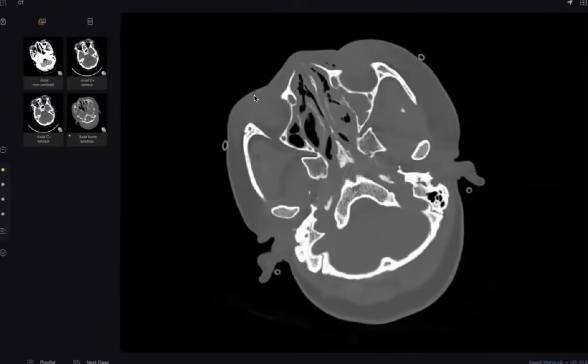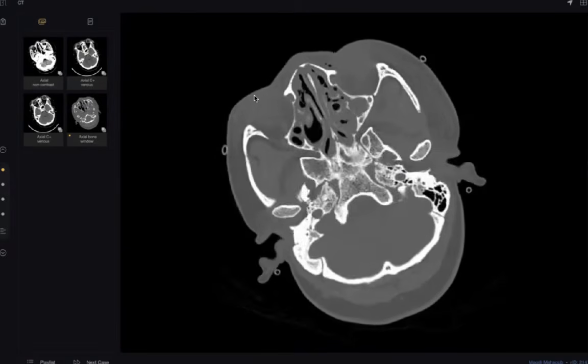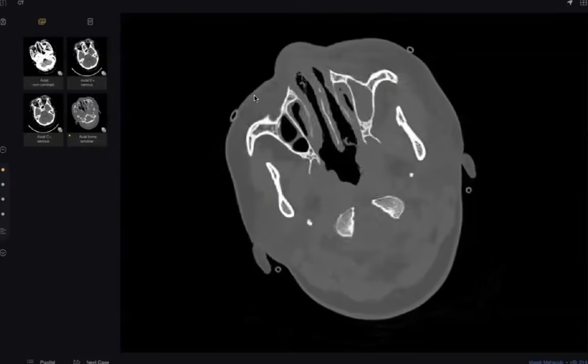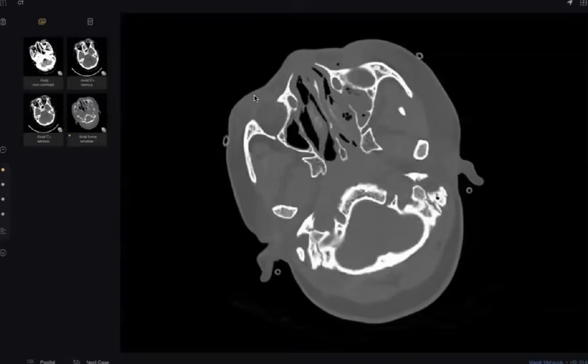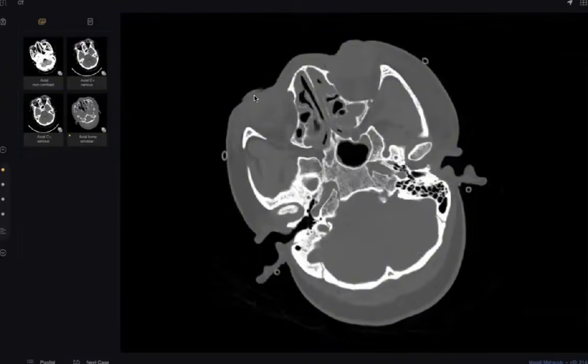Do you have any clue here in this CT, whether this is fungal or not? Okay, in this CT, it is not typical fungal to me because I couldn't identify the hyperdense hyphae or the fungal balls, which are usually hyperdense in the CT.